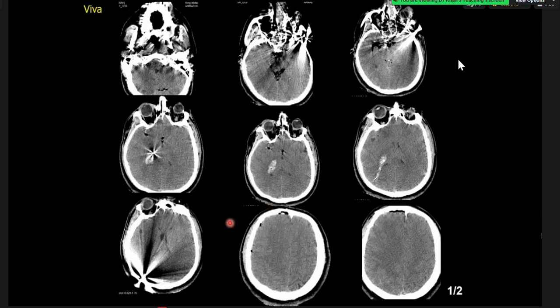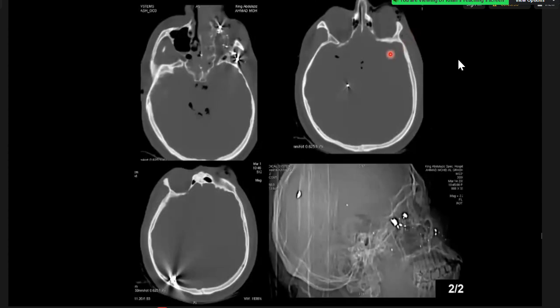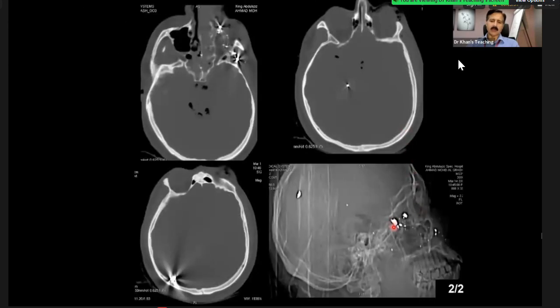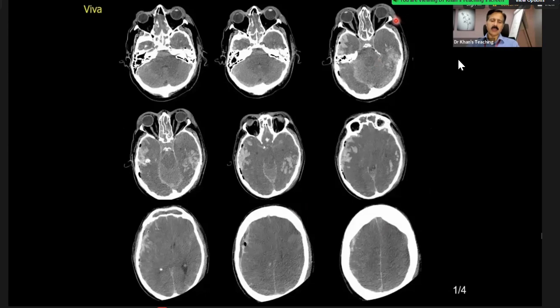I'm just trying to categorize the hemorrhage. What is this? You were worried about an embolization clip. There is metallic density. That's the hint. Oh, he's got a traumatic injury, like a bullet injury or some sharp injury. So I just wanted to show you this patient because otherwise you will get confused, as you did get confused. It's very easy. Shotgun, multiple pellets, and more or less brain dead.